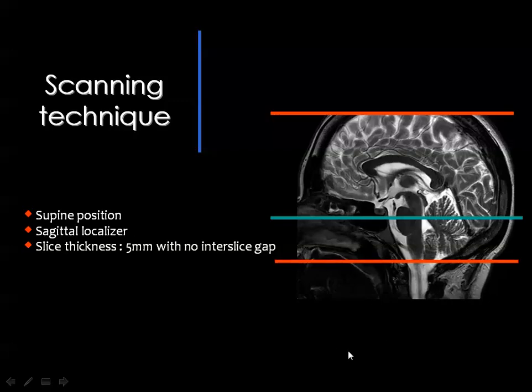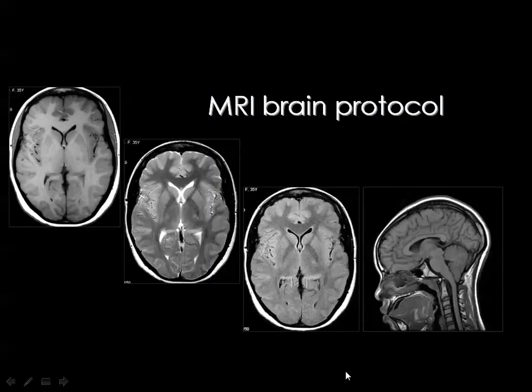and this will make some disturbances whenever reading the images of the MRI, because we feel that all the contents of the posterior fossa are just the cerebellum and the brainstem. But in cases of MRI, you should consider that some of the occipital lobe is located posterior to the cerebellum, because we do not have an angle to scan the brain.